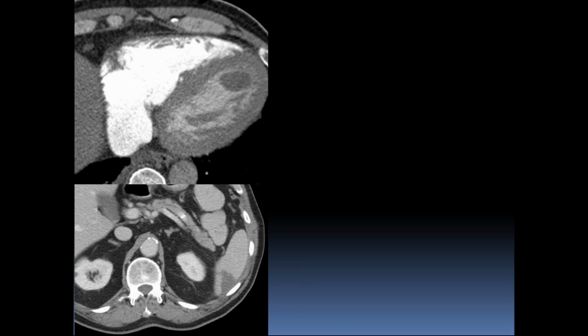The next thing here, some people may know this, some people may not, depending on how much cardiac imaging you've acquired in your training so far. There's an abnormality sitting in the left ventricle, and this is a thrombus. That's what it is by location. That's where they grow.